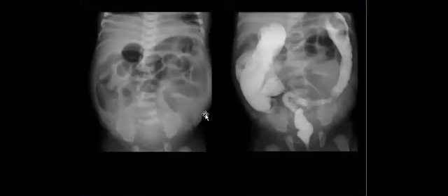Dilated bowel loops: you are talking about obstruction. In your approach, is it high or low? Then when they give you the enema, what do you describe? It will be the last case because we have less than 1 minute.